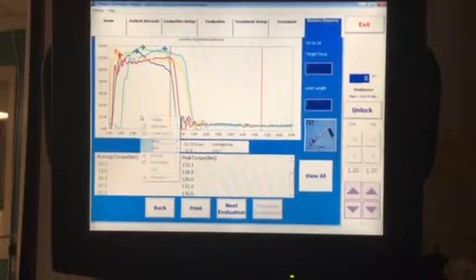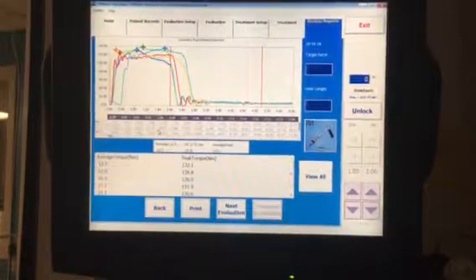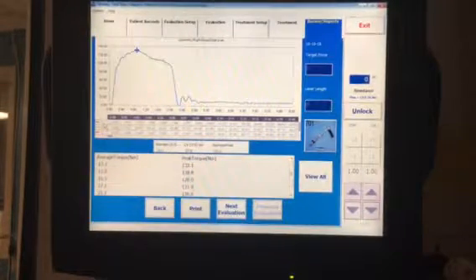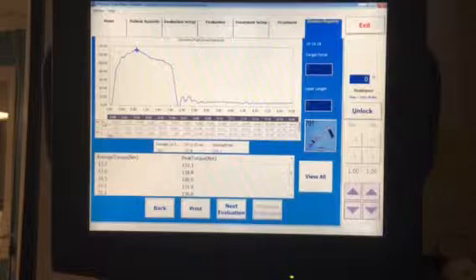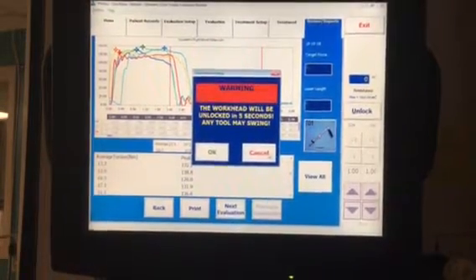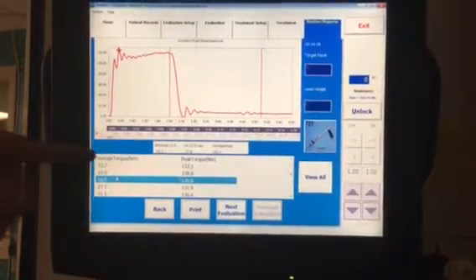The next thing you're going to do is right-click on the actual graph itself. You can scroll down to Data Editor. You click on Data Editor, and now this is going to populate the different data on both the Y and the X axis. Now, this is where it becomes a little bit tricky because you have to look for the best 3 trials. For example, trial number 3 looks really good, so I'm going to click on it, and I can actually select it. You can select the different trials down here.